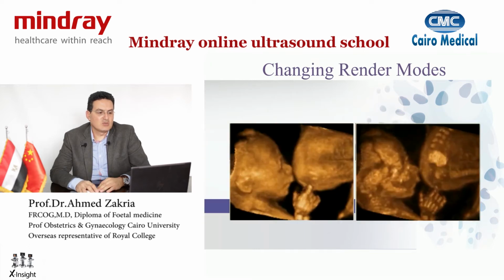Can you change those rendering modes? Of course, because you already have the solid data there. So once you have the volume of the structure that you've obtained well on the 2D image, which is what I'm going to explain later while we do the live demo, you can change it into, for instance, a maximum mode, and in that you can see all the bony structures. You can see the spine, you can see the vertebrae, you can see the skull, you can see the fontanelles, and you can define them clearly here.